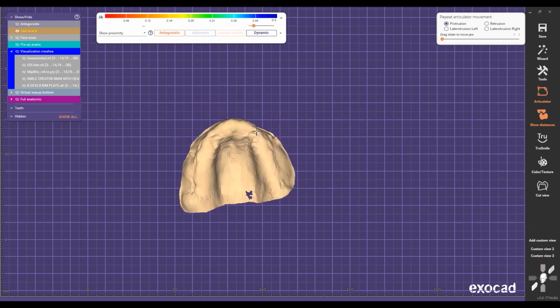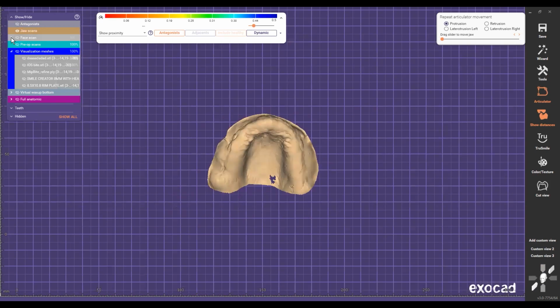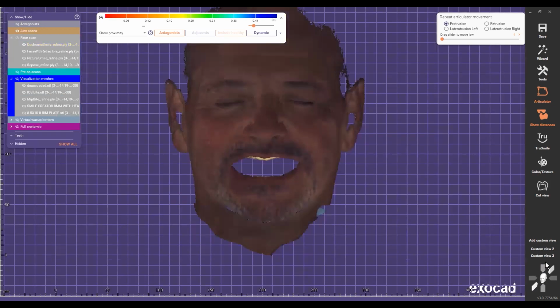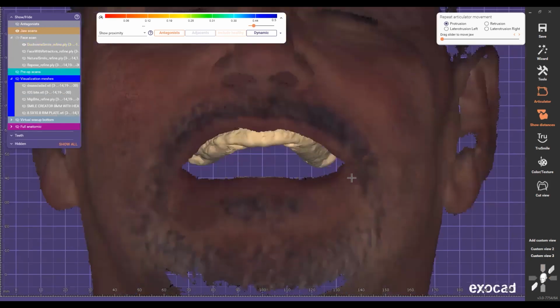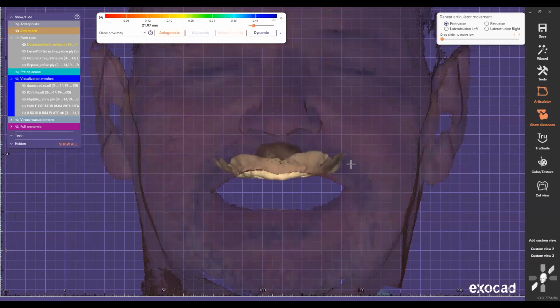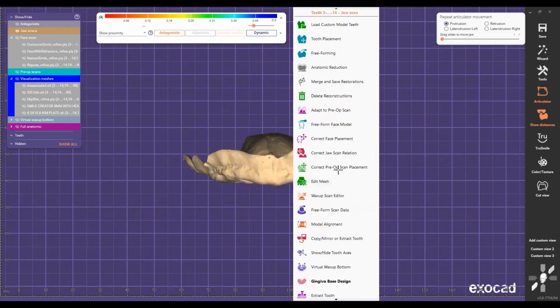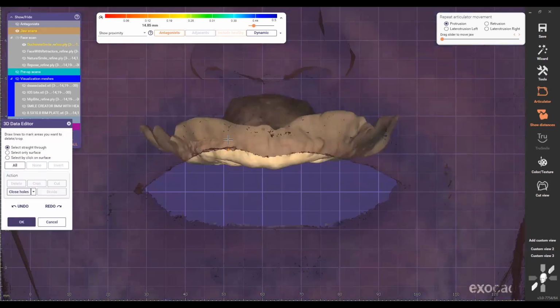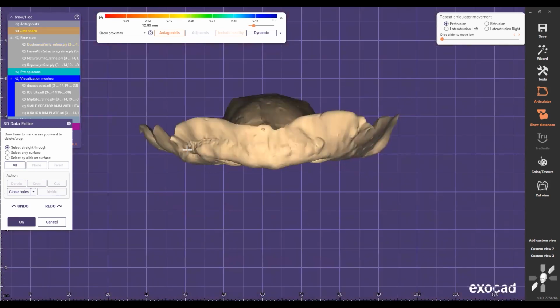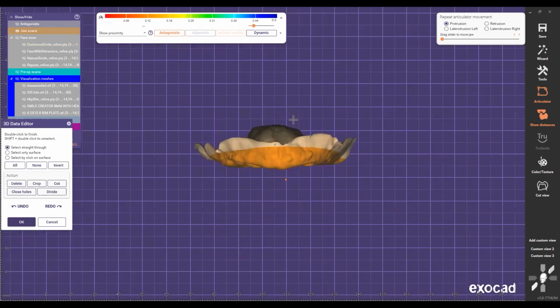So now from here, I'm going to go ahead and start checking the facial scans in Duchenne smile. The goal of the Duchenne smile here is to hide the transitional line. So what does that mean? I'm going to start chopping this and count 4 millimeters apical from this to here. That way I know that I'm going to cut enough bone, and I'm not going to just cut 20 millimeters of bone.